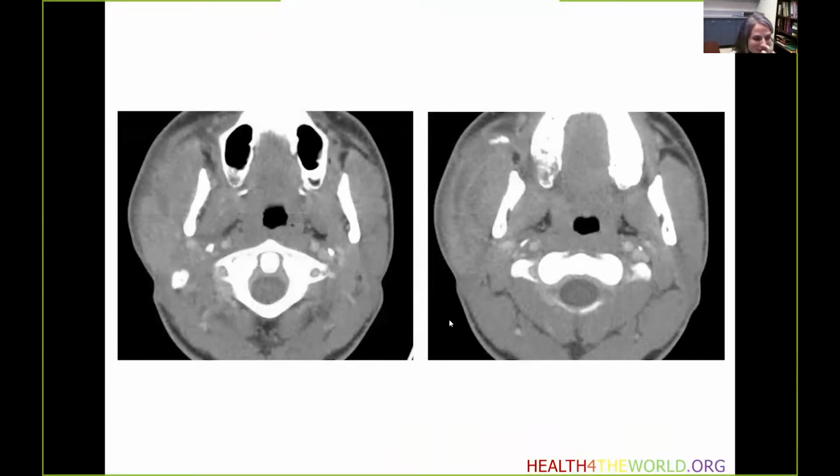And this case is that of an older patient who presented with swelling of the right face. And what we can see here is this hyperdense calcific density in the buccal space, and there is almost a tubular structure and or fluid collection just superior to the masticator space and also involving the masticator space, with significant surrounding soft tissue swelling and skin thickening and subcutaneous fat stranding.